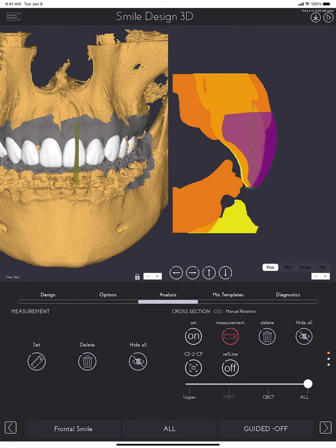If you press and hold on this square in one of the edges, you will be able to adjust the height if you like.